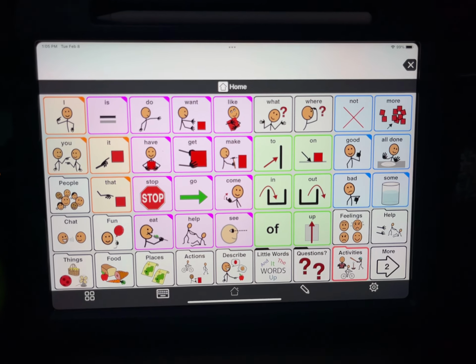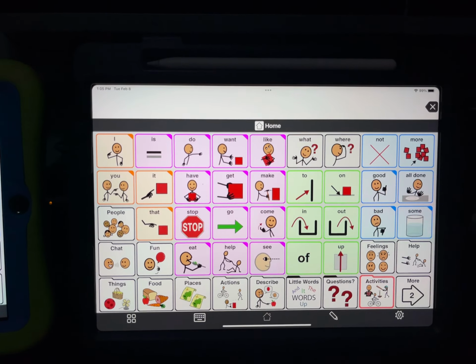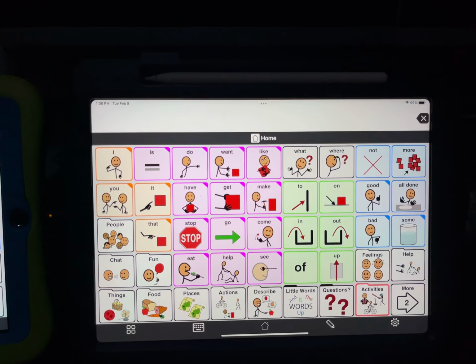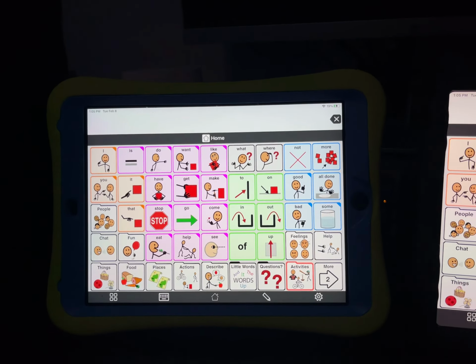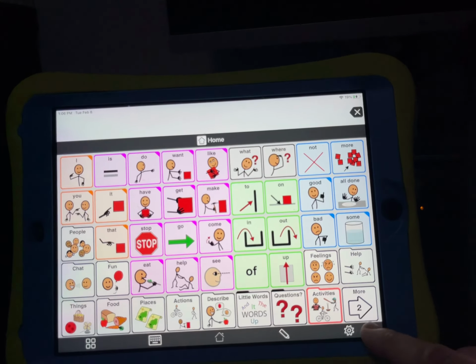When you have two children, you have to decide what is more important. Usually the child's more important, but I mean, if you think you're going to customize them a lot, maybe you just have one master one and then always copy it. And then just do a few changes every time you copy it to make them seem a little more original. So a few things you can do if you like.